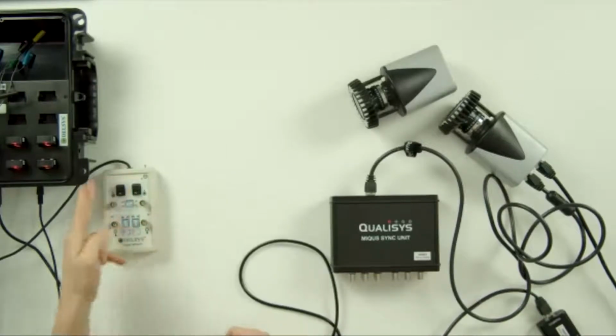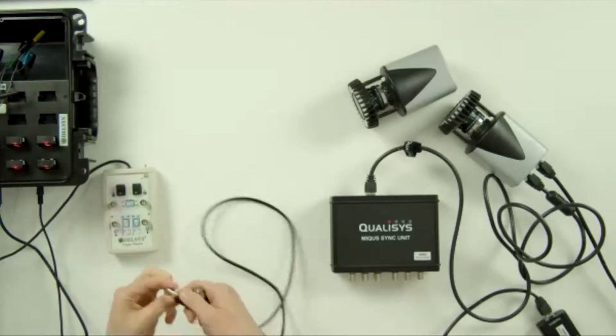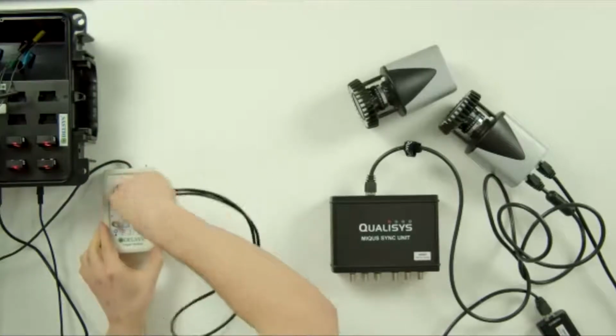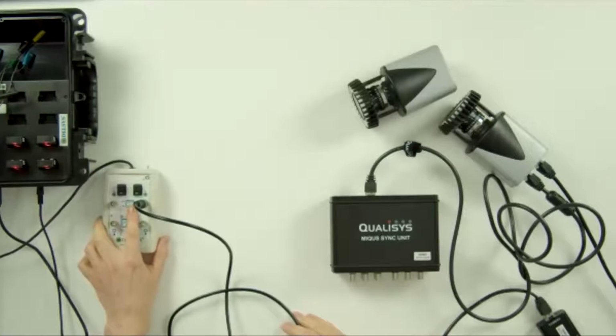And the trigger module has two different sides, a green side, a red side. Green means start. And then there's two sections, a top and a bottom. So we need to go into the top right-hand side, where it's a trigger input. On the Delsys trigger module, there's also a pulse polarity switch, which is quite hard to see on camera. It's a small white switch where you can change from being negative or positive, or falling or rising edge, for the TTL pulse. And by default, this should be set to the negative or the falling edge.